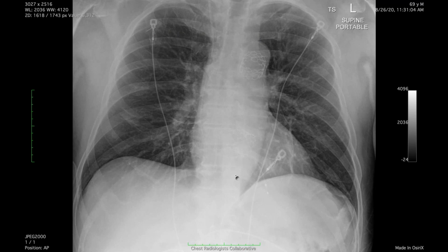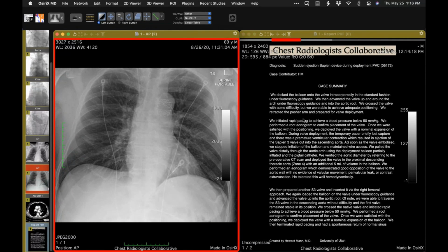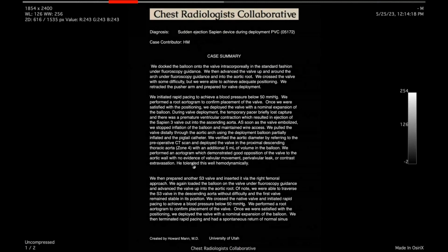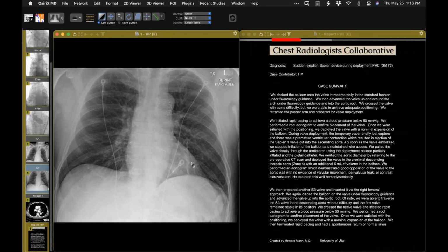I'm trying to remember, someone showed a case of this in the webinar before. I think Travis did. So the other valve there, do they do anything with it so it doesn't act as a valve? No, they just basically fixed it against the wall. Yeah, I think we have an almost identical case that Travis may have shown. Yeah, I think you showed that one. Basically, it's a valve and it's there, but it opens up and doesn't impede blood flow, so no big deal, as far as I know.